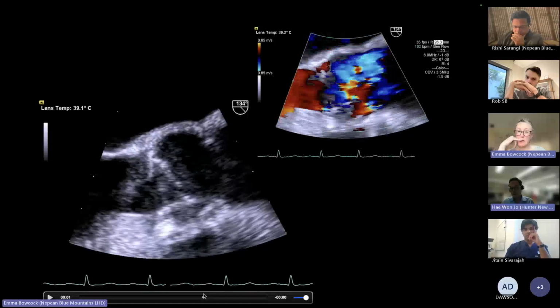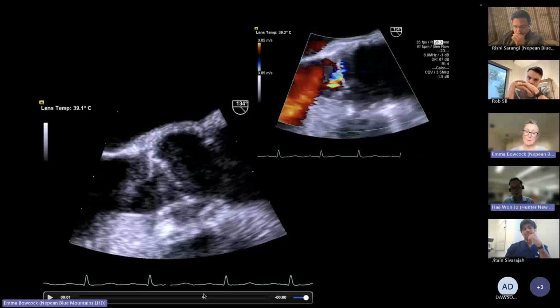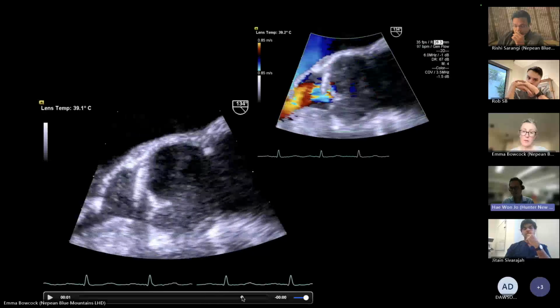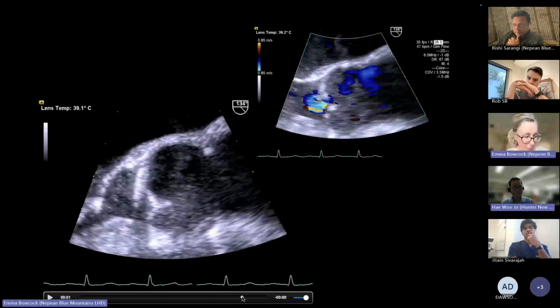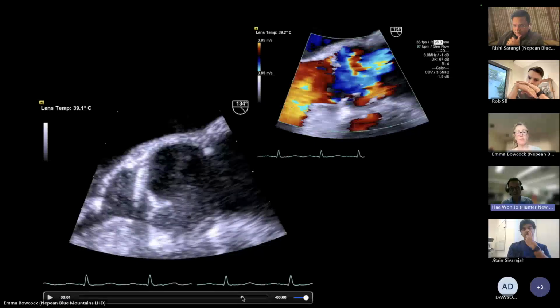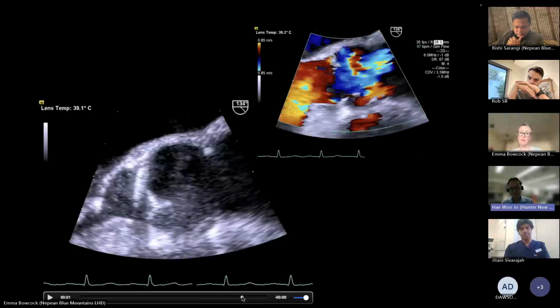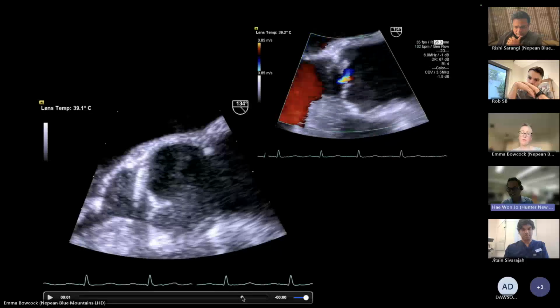When it's so eccentric like this, you can't usually use it. I mean, evidence of raised LV end diastolic pressure. No, in terms of severity of AR, sorry. Just AR. Eccentric jet, some direction like this. I mean, density is not going to be useful. Pressure half time is probably still going to be useful, actually. That's what I would use.